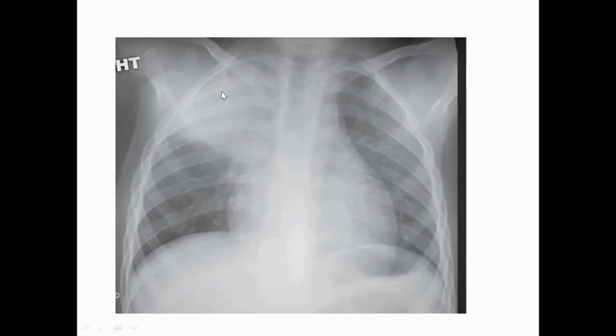So consolidation, is it only pneumonia? Are you only going to say this is due to pneumonia? For sure, no. What's the meaning of consolidation? Consolidation means that alveoli and small airways are filled with dense material. If the dense material is pus, the consolidation is pneumonia. If it is fluid, the alveoli and small airways may also fill with fluid. If it's blood, it's a contusion. If the alveoli and small airways fill with abnormal cells, it is a mass.